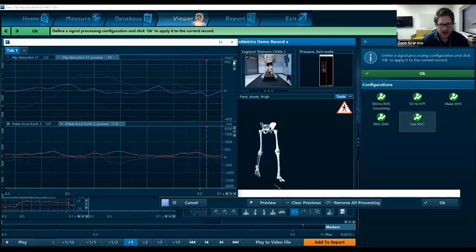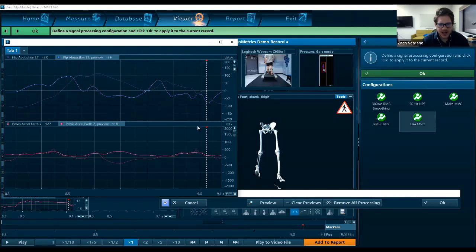You can see how that jagged response, or those two peaks that were back to back, probably just from some noise being pushed through the derivative, went away, and we have a bit more of a smoother signal now to operate while still maintaining some of those peak values that we had seen previously.